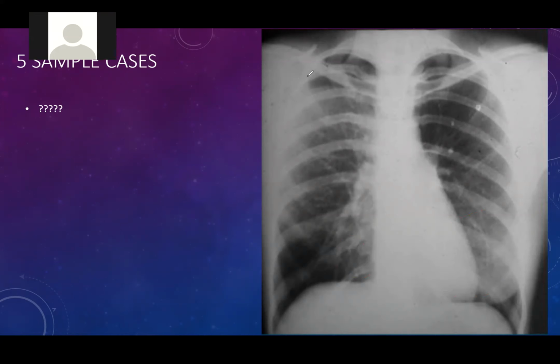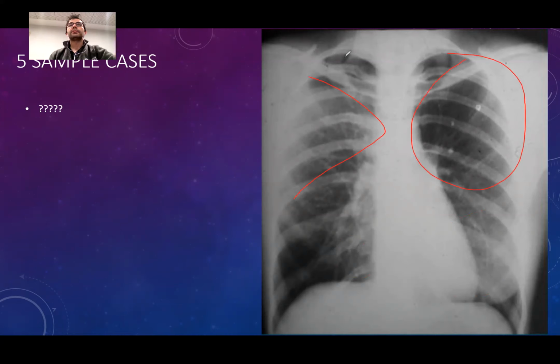Okay. More than that, doctor, I'm seeing some asymmetrical appearance on these areas, right? Like there's some big asymmetrical appearance between the left and right side.